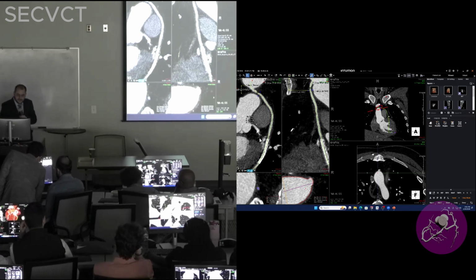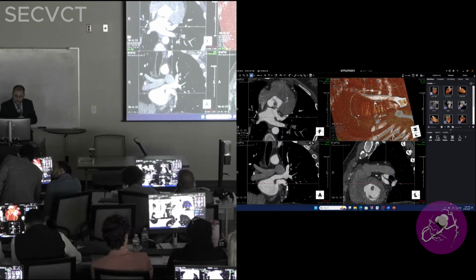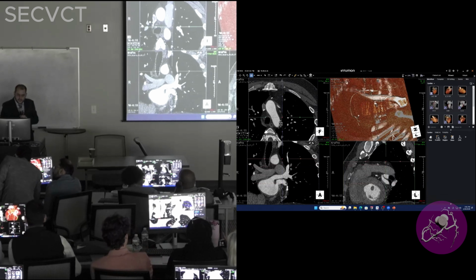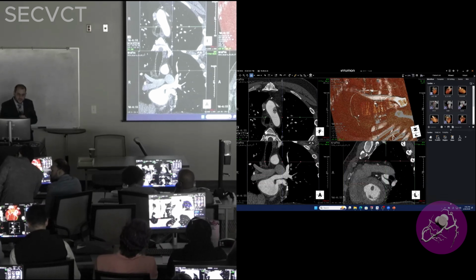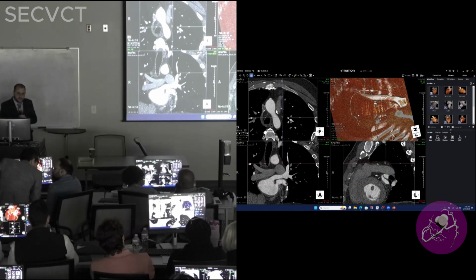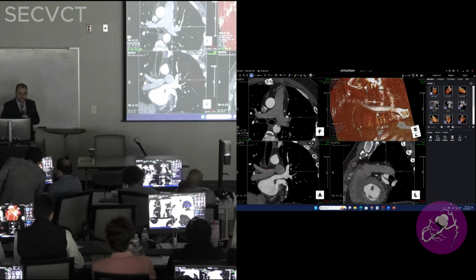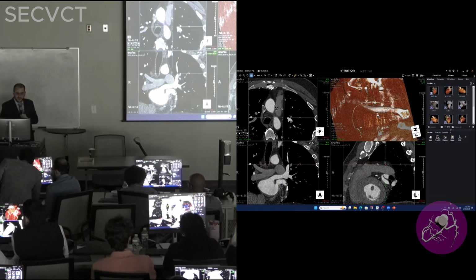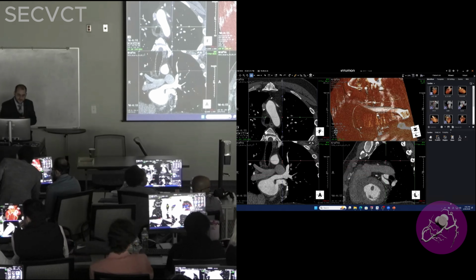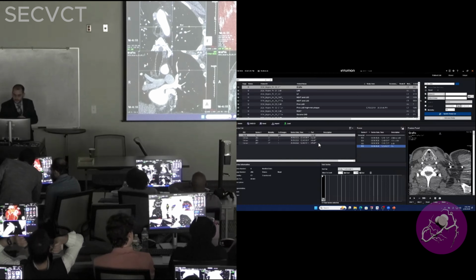And so we know that this graft gets attached to probably the OM branch. And then, right, just below that graft, there was a stump, as we said. We were not able to identify the venous graft to the RCA. So that was occluded. Okay. Probably it was here. Sometimes you cannot track a fully occluded venous graft. Okay, let's see then what the invasive angio showed.